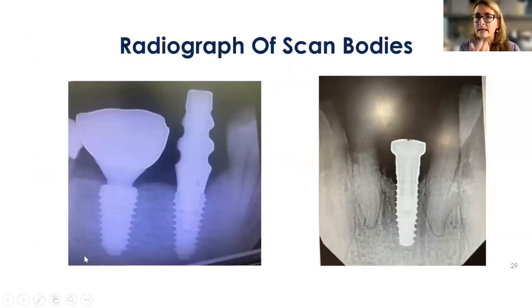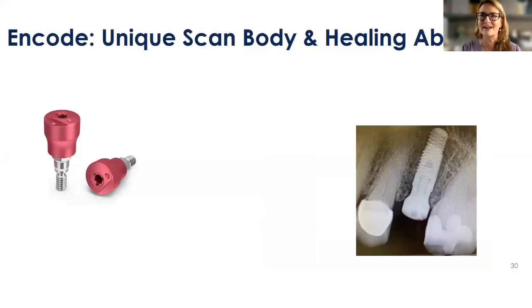Here's a couple examples of some x-rays of the scan bodies, which I thought turned out really, really well. You can see that they are fully seated, right? Like you're looking here, and you're showing here. Thanks to my lab partners for that, right?